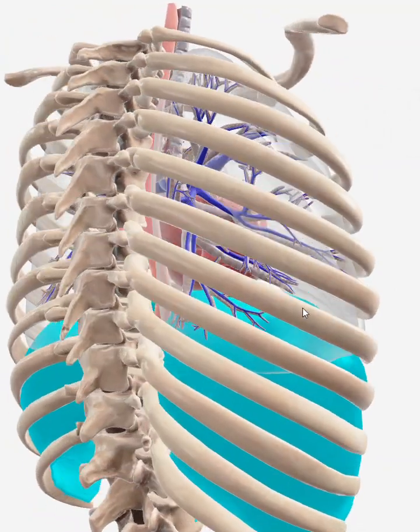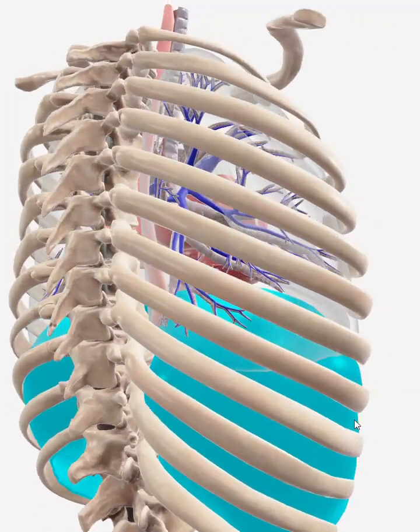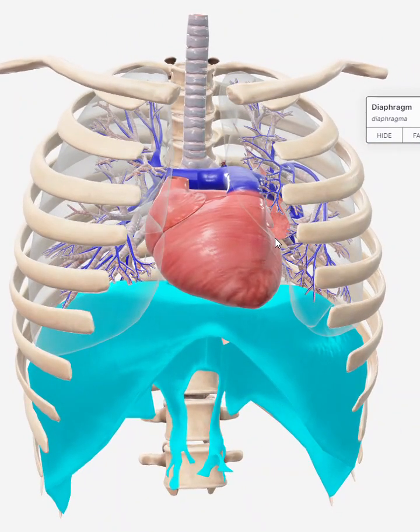And then also keeping in mind that if we penetrate all the way through, then we should be able to see the spine, at least a shadow of the spine, through the heart. That lets us know that we used the right amount of kV for our technique. Now, if we do use too much mAs on our technique, what's going to happen is we're going to burn out these little tiny vessels.